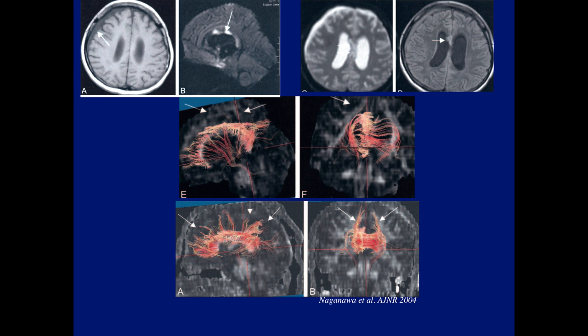People have also used tractography in the region of the corpus callosum to look at what happens. For instance, here's a patient who had trauma and hemorrhage involving the corpus callosum, and lower down here we have a normal showing the distribution of the fibers from the corpus callosum to the cortex, and we can see it on both sides of the midline. While in this case, there's a plethora of fibers. Here there's only like one fiber, maybe another one. So there's destruction of the fibers coming out of the corpus callosum or going towards the corpus callosum.